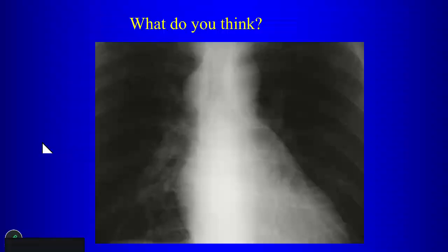What's the abnormality on this chest radiograph? It's like a right paratracheal opacity. Yeah, so there's a right paratracheal rounded opacity. So in terms of differential, what might you start with? What could that be? Probably lymphadenopathy. Yeah, so lymphadenopathy might be the first thing you think about, right? If you see a right paratracheal mass like that, okay?